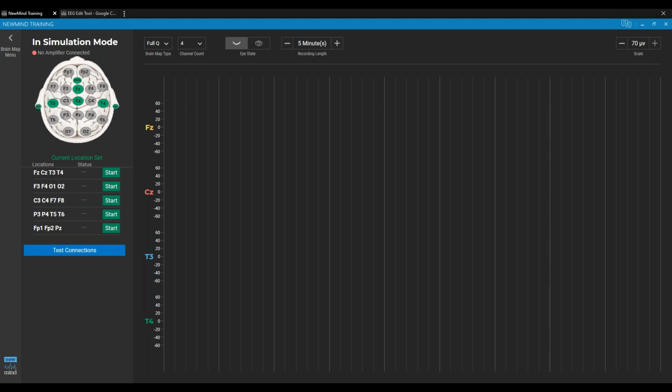But that beta spindling is another one that our software just views as artifact, and it's trainable. Well, I'm thinking leave it, don't artifact it, leave it in, and then see if there's a change. With the spindling, you may have to just count the episodes or the length of them manually, but it's just a thought.